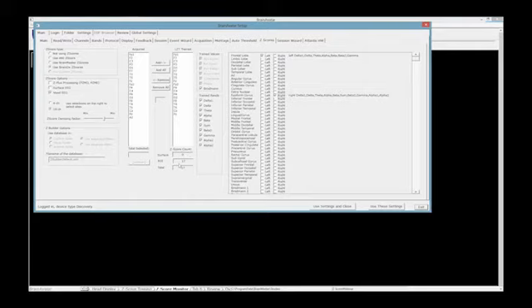So you have the capability of, even if you wanted to train both the left and right, to make your left a little bit more direct than your right. You can do the right all 10 bands and the left only 7 bands, or 4 bands, or 1 band. And it gives you that flexibility.